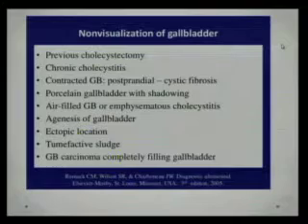Okay, just one last thing I want to let you know, and all of us have been faced with this entity when we come to scan with the ultrasound tech. Patient says gallbladder is not removed. Tech can't find it anywhere. You can't find anywhere in Epic whether the gallbladder has been removed or not, but you can't find it. Well, this could be one of the probable reasons why. Most commonly, previous cholecystectomy, patient is having a hard time remembering that, or there is inappropriate documentation in Epic. Chronic cholecystitis, a chronically contracted, thickened gallbladder. Even though the patient is fasting, it's not distending.